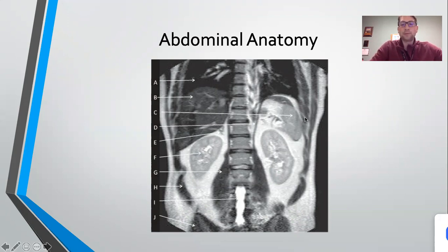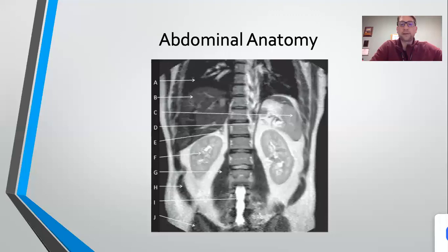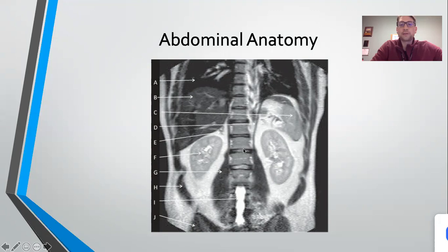And what image plane? Is coronal. Okay, coronal, and what type of weighting? T2. Good, and how do you know that? Because the CSF, I mean the water, I mean fluid. Yeah, here. So CSF fluid around the spinal cord. We can't actually see the spinal cord yet, but we know this is the CSF because here's the vertebral column. And this is a coronal because we're going A to P.